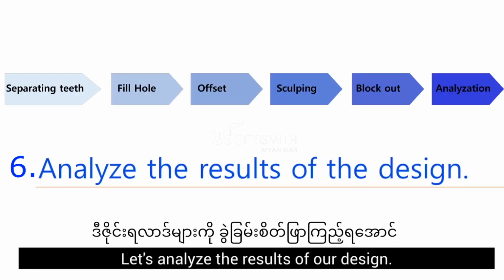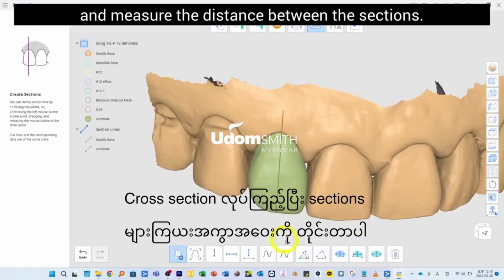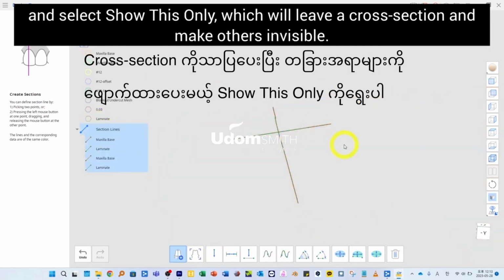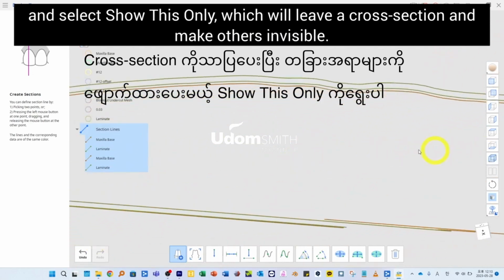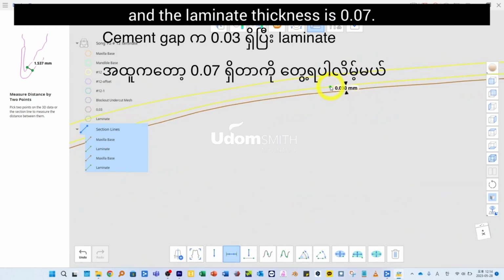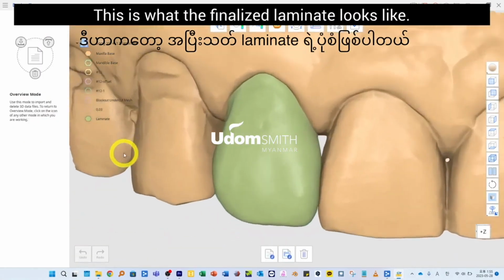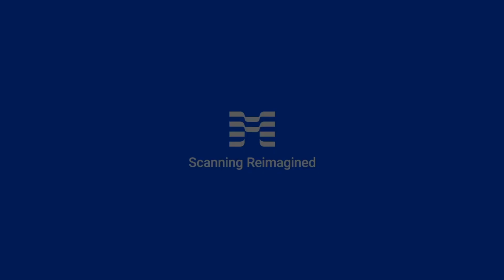Let's analyze the result of our design. Take a cross-section and measure the distance between the sections. Right-click to bring up a pop-up menu and select Show This Only, which will leave a cross-section and make others invisible. You find that the cement gap is 0.03 and the laminate thickness is 0.07. This is what the finalized laminate looks like.